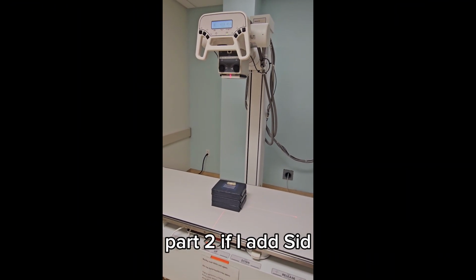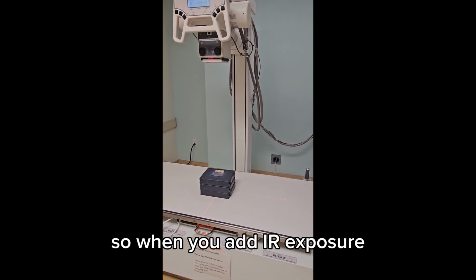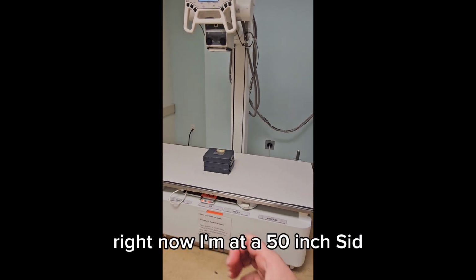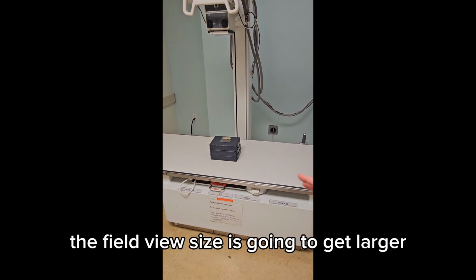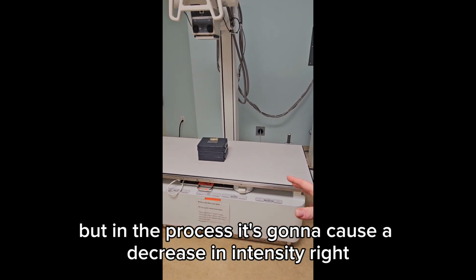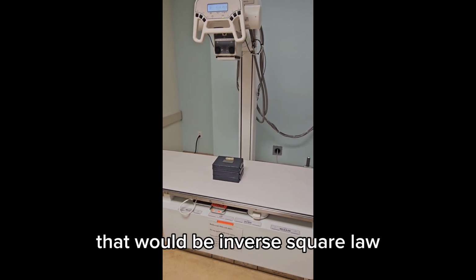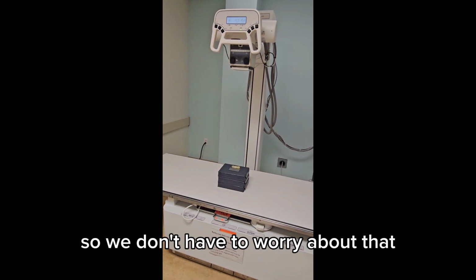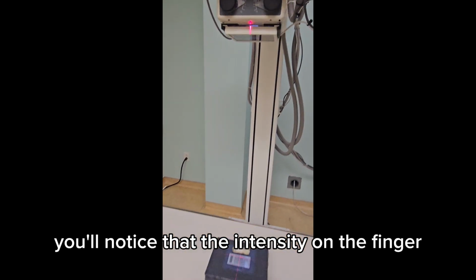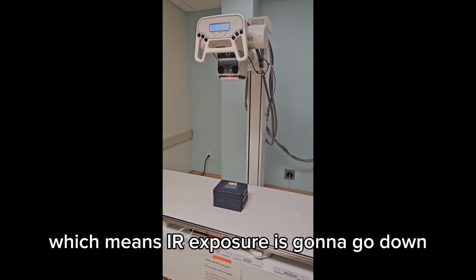Part 2. If I add SID, what will happen to IR exposure? So when you add IR exposure, or I'm sorry, SID, right? Now I'm at a 50-inch SID. The field view size is going to get larger. That's why I just increased collimation. But in the process, it's going to cause a decrease in intensity, right? That would be inverse square law, but we never do inverse square law, so we don't have to worry about that. So because I'm backed up so far, you'll notice that the intensity on the finger is less than it used to be, which means IR exposure is going to go down.